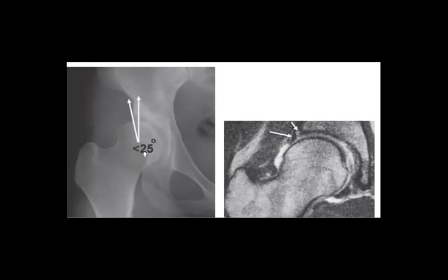Okay. As you see here, this patient is more exposed to the risk of tears, as you see the labral tear here. Typically, it comes unilateral. Okay. Is it clear?